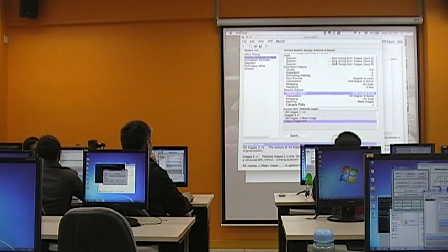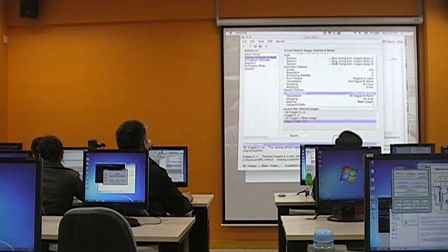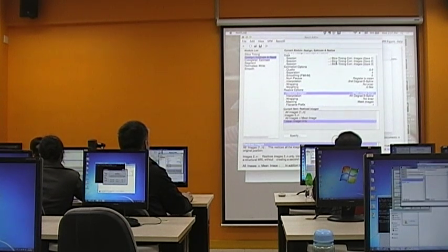All these transformations on the XYZ plane and the rotations along the XYZ axes will be stored in the header file as what we call a directional cosine, which you need to transform this image. But the raw image, we didn't touch at this point.